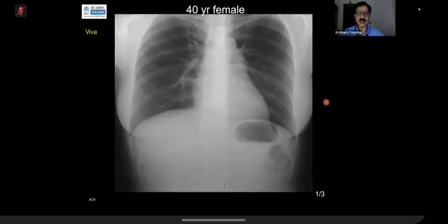Now, this is a classical exam case. Do you see a looser zone here? Over to you. Okay, open for chat. Anybody has picked up a looser zone? Where is it?